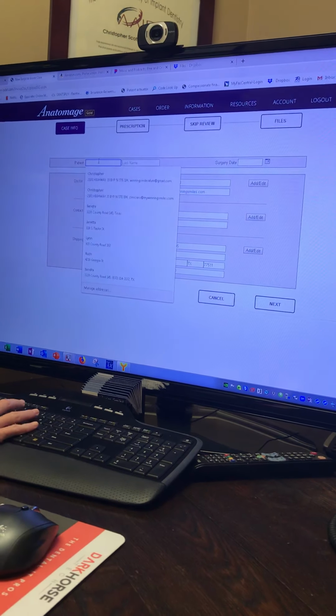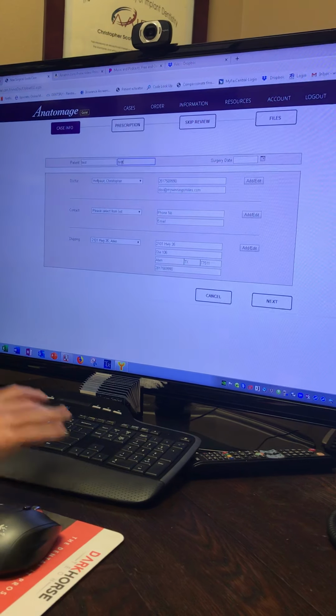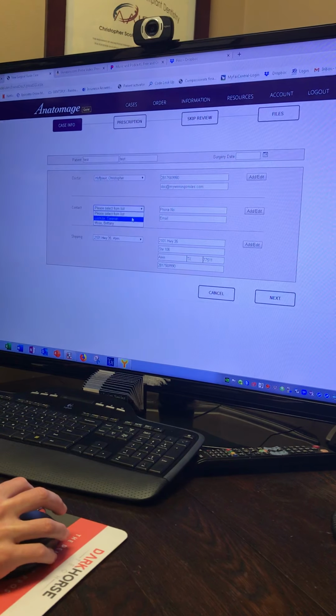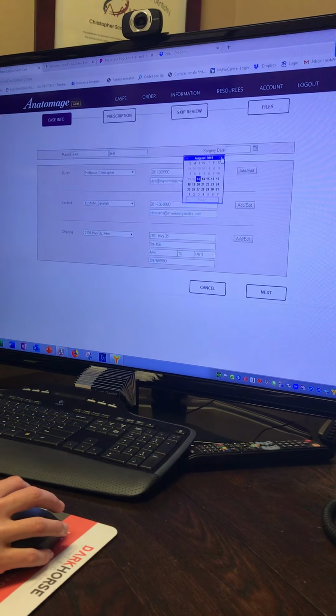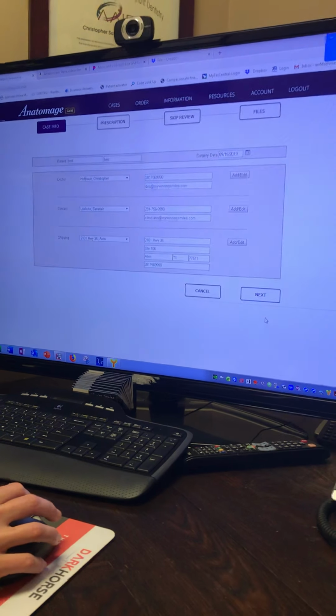I'm going to do a little test run. We'll put test here. Same thing here for the last name, test. The doctor is going to be Dr. Hoffpower. Contact, they'll have to add you in there, but we'll just put me in there. The surgery date, like I said, it's always about a month out, so you just kind of guesstimate because it usually takes about that long.